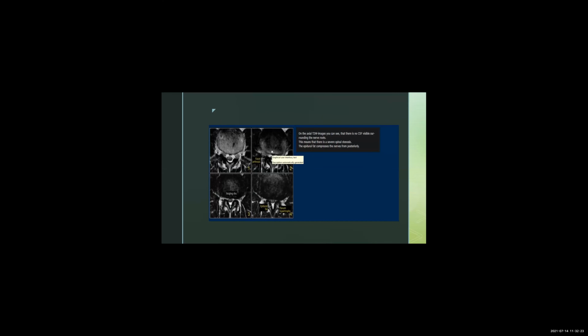So this is an axial image. In addition to tightening of your spinal cord, you can actually get tightening of the holes where the nerves come out, called foraminal stenosis. Here we have a disc protrusion or a disc bulge. Here's your spinal cord, and here you can see the little nerves. Here's a little nerve coming out of the spine, and it's very tight. Look, it has to squeeze through here. Because this thing is very enlarged, it's pushing on it. So that can also cause back pain.